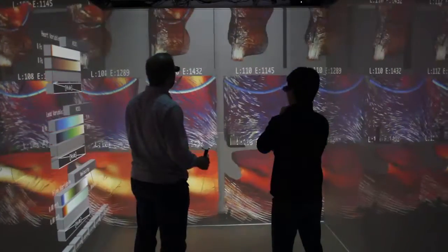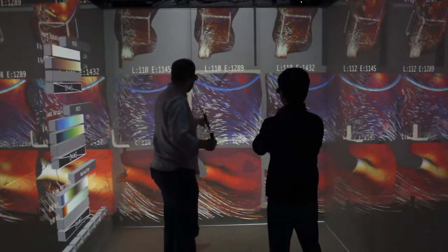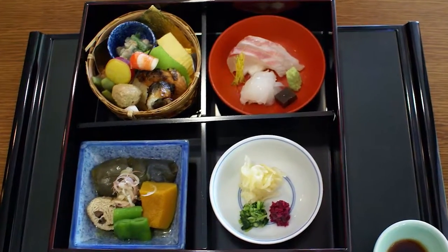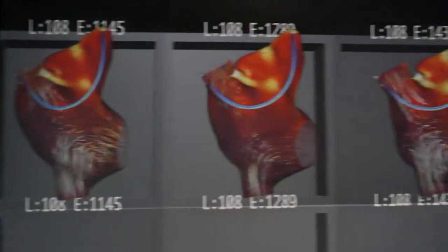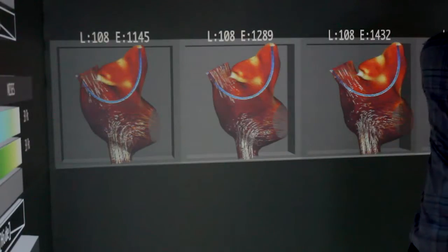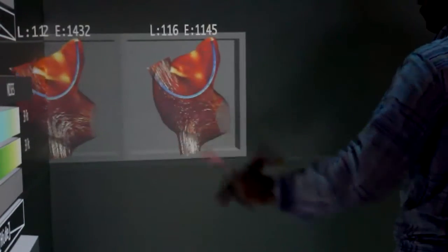BentoBox is an interactive virtual reality technique designed to address this hard problem, which is known in the visualization research community as a form of ensemble visualization. Inspired by the artfully arranged bentos used in traditional Japanese cuisine, each data instance is assigned a column. In this example, we have 10 columns, one for each of the simulation runs. The first 3 are for the shortest leads, then the medium lengths, the longest, and finally one extreme case.